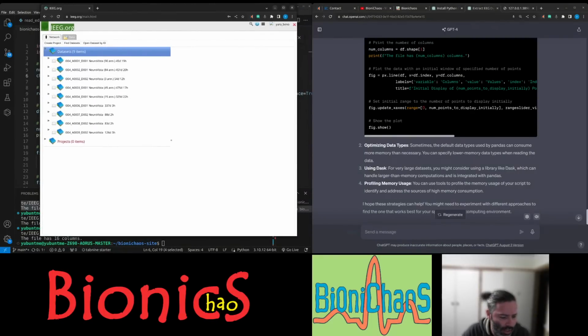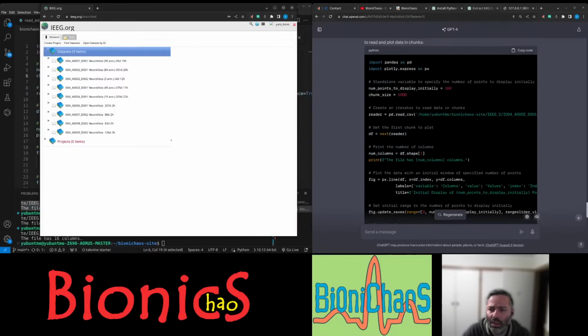We'll open this one here. There are 2 of them. One is much longer. Yeah, look at this one.